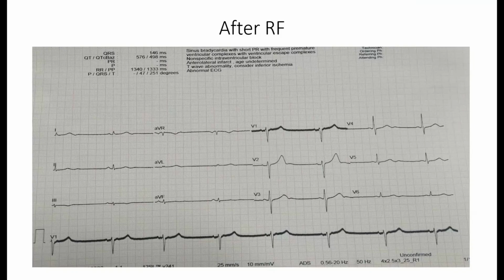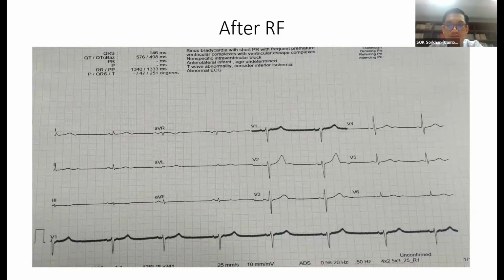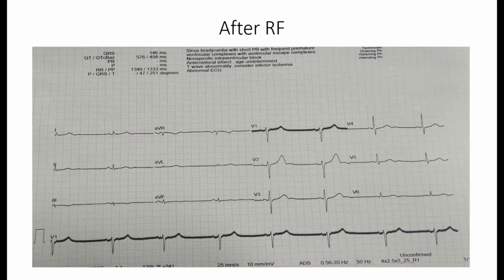That's an important issue because of that white spot that you had, the second spot that I showed you. Next time when you have such a question, you can do two things. One, you can go there and pace map with low energy output to see the morphology of that area and other areas as well. So compare which one you want to ablate first. Maybe this patient had the same PVC with a slightly different exit site change. Because of a deep focus, you may just create a conduction block in a more common exit site.